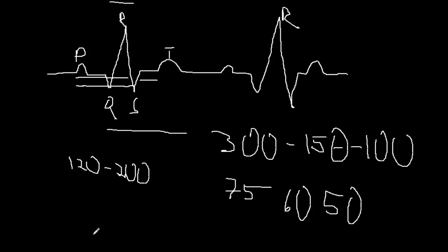So you have P, QRS, and then you have P, QRS, and this interval is going to be like 0.08 seconds or something, and then it gets to be 0.12, and then it's 0.16, then 0.2, then 0.24, and then you have a drop beat. And then it starts again at 0.06 or 0.08. That's an example of type 1, where it gets longer and longer, drop beat, and it's really short again, longer and longer, drop beat.